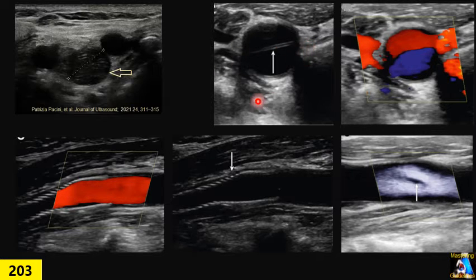And very important for this diagnosis is that your optimization should be very good, because if the image is too dark, you can miss it very easily, or if the gain is too much, you can create artifact and get the impression of dissection. So with all those features, we can detect it. I'm not going to talk about this topic in this lecture.